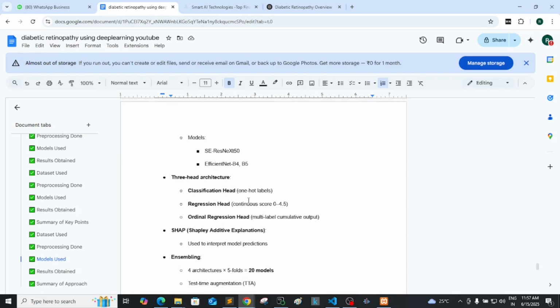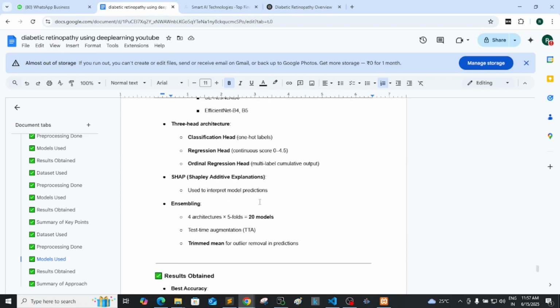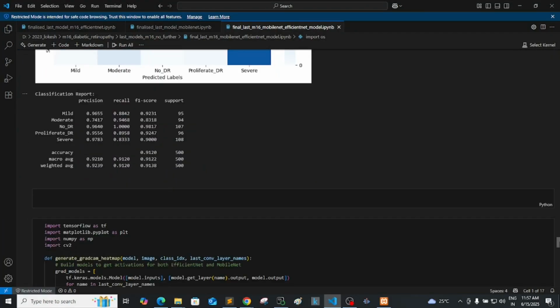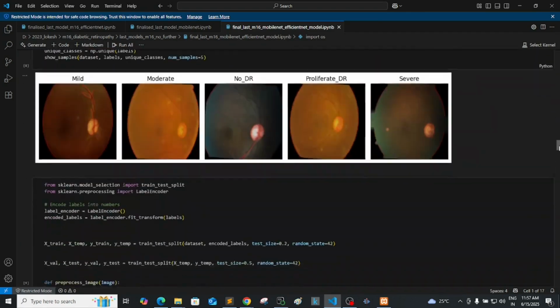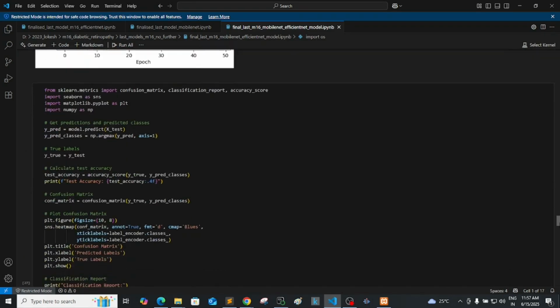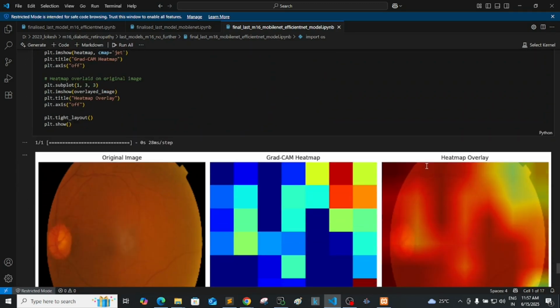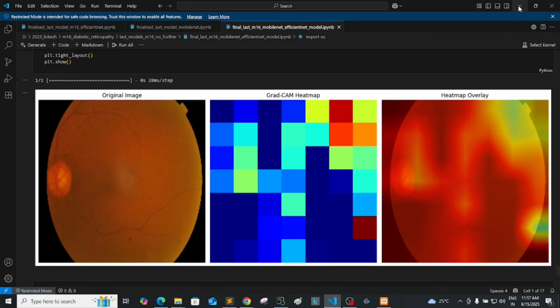Once we take all these models, they are using SHAP for explainable AI, but in our case we are trying to concentrate on using GradCAM for a better result. It will give better analysis with the images and highlight their results. So for example, what is explainable AI imagery? I will show one. So like this, we are going to get GradCAM based explainable AI.